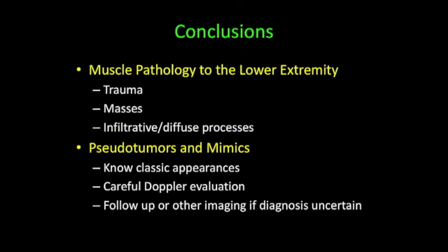Be really careful with the Doppler evaluation, especially for those low flow tumors that I showed that can look like fluid collections. And if there's any uncertainty, we can't always get the exact answer with ultrasound. Have a low threshold for follow-up or other imaging if you're unsure.